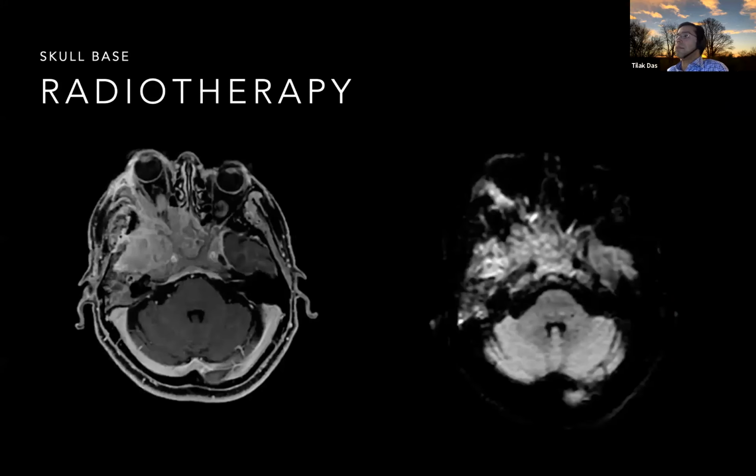And you'll find that the oncologists who are very good at outlining these tumors will sometimes ask for your help. So it's helpful to know which sequences are quite good to delineate these tumors, but also important, therefore, to understand the anatomy to help guide their treatments. So exactly how far does this tumor go?